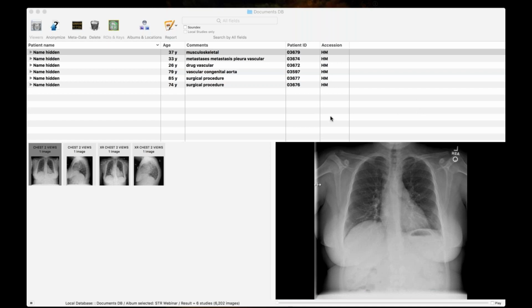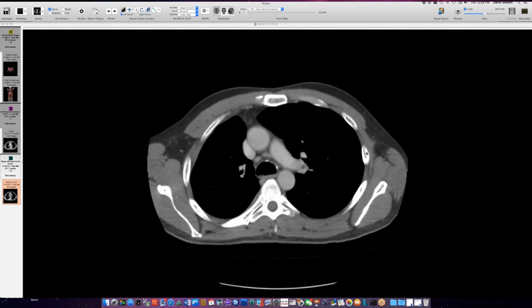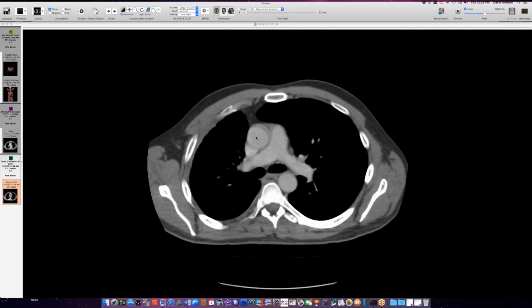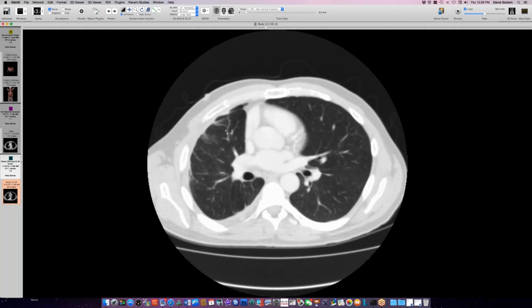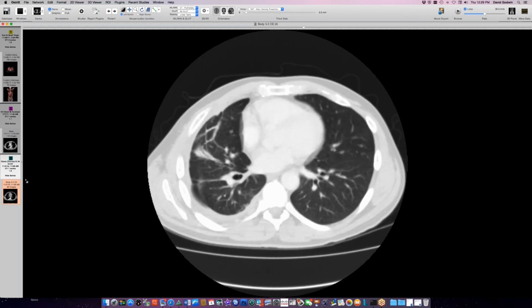Okay, David. Here we go. Okay. Should be showing a CT scan. Yep. This is from 2010, and keep an eye on the anterior mediastinum because it looks pretty normal here. We have some fat in the anterior junction line there, looking pretty good. We do have some pleural abnormality here in the right hemithorax, and we have some adjacent atelectasis in the lung here, some round atelectasis and some radial bands and things like that. So we have a pleural process at this point.